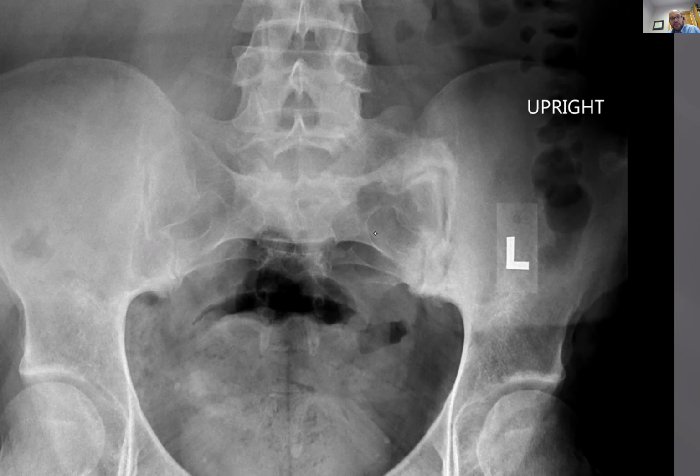Yeah, this is an awesome chiropractic case. I mean, this thing, you guys should be crying right now. This is so cool. Here's why. Transitional segments, especially the unilateral ones like this with those accessory joints, cause some significant asymmetric biomechanical changes.